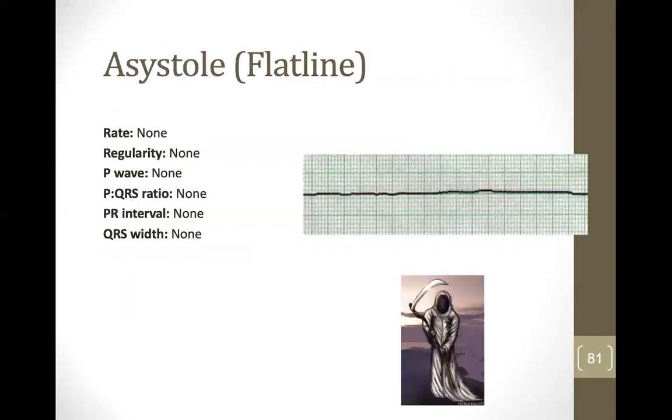The last rhythm we have is called asystole. Now remember, systole means to be contracting, for the heart to be working.